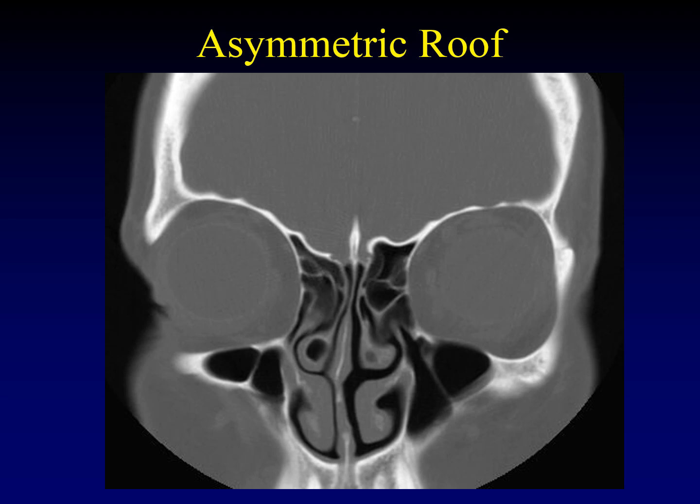Symmetry in the nasal cavity roof is really important. You want to have cribriform plates that are symmetric, and you want to have fovea ethmoidalis that are symmetric. You can see in this case, the right fovea ethmoidalis is about 5 millimeters lower than the left. We want to talk about any asymmetries here. This is important surgically because if you put an endoscope up to this level on the left, and then you pull it out and set it up to put it up to that same level on the right, you're going to perforate the anterior skull base, and that's considered a poor clinical outcome.